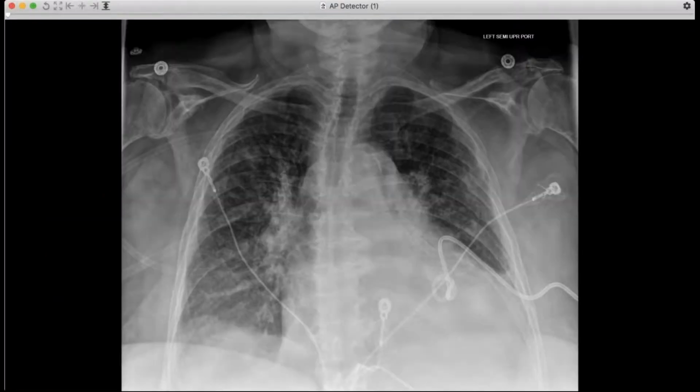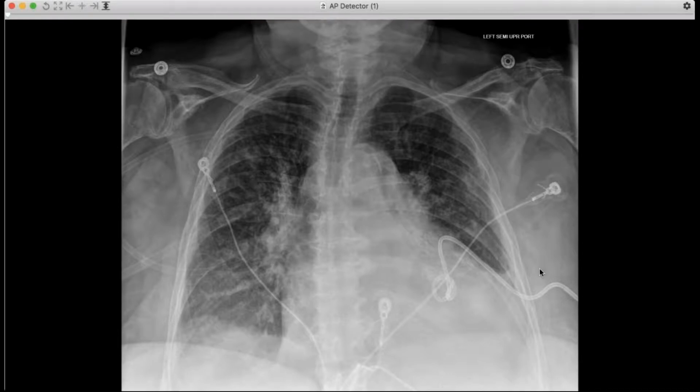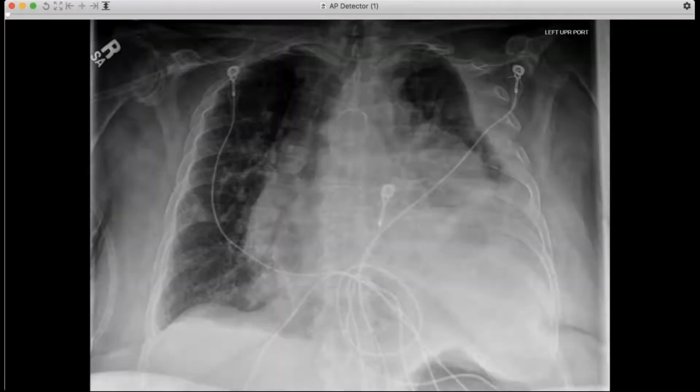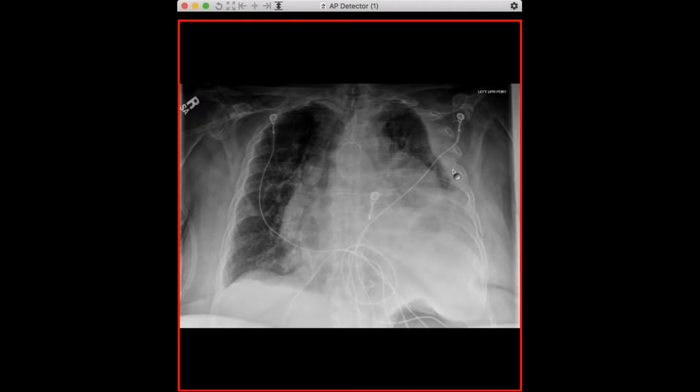Okay, and then my last case is a good teaching case for a variety of reasons. You should see a portable radiograph. So this is an elderly patient who has chronic heart disease and had some trauma and had a pleural effusion and had this drain placed for the pleural effusion. You see there's some lobar atelectasis, maybe some edema. And this was done the morning of the day that this radiograph was done, and everything looked fine. Later that afternoon, they had pulled the drain out, but the patient was becoming progressively short of breath, and I will put the two up side by side.